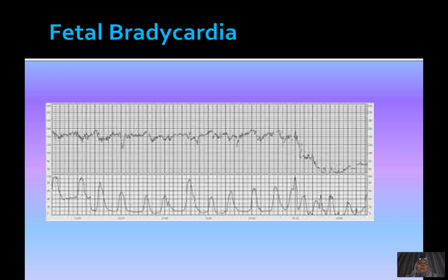And then at some point down the line, suddenly you have a sharp drop and the baseline rate does not recover. This is 4 minutes, and it goes on down. So we see 4 minutes on this strip that it remains low, and I guess that it was not continued on this strip because then preparations were made for delivery of this baby.